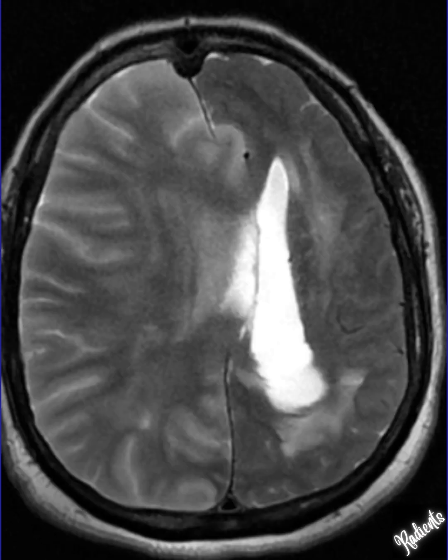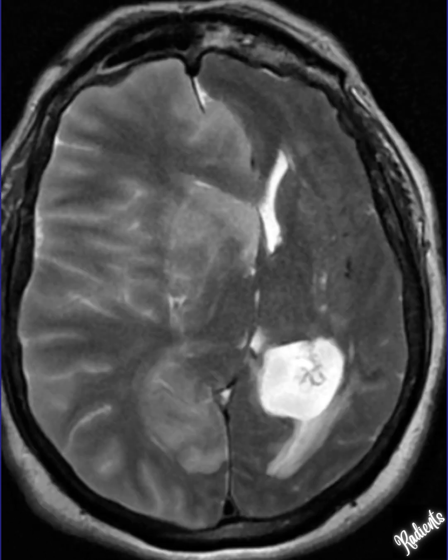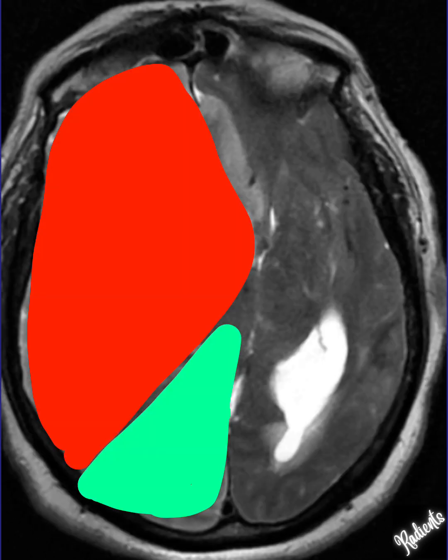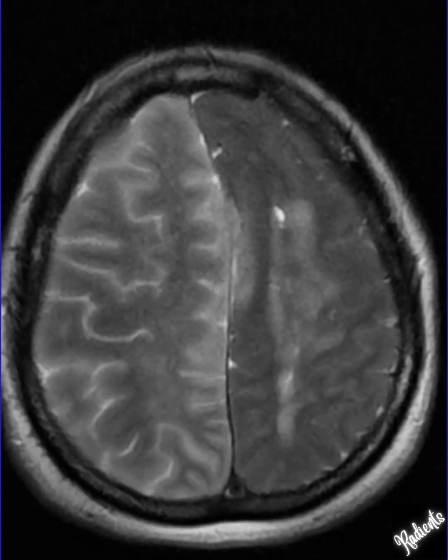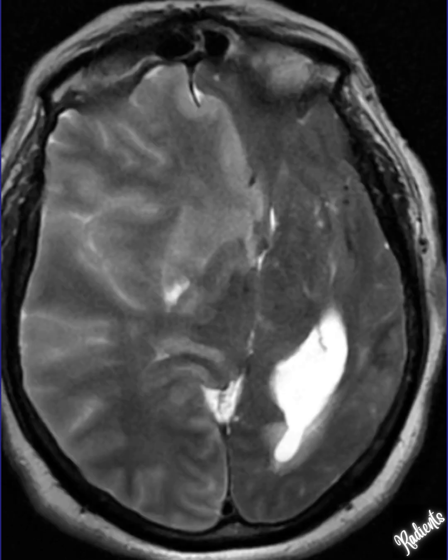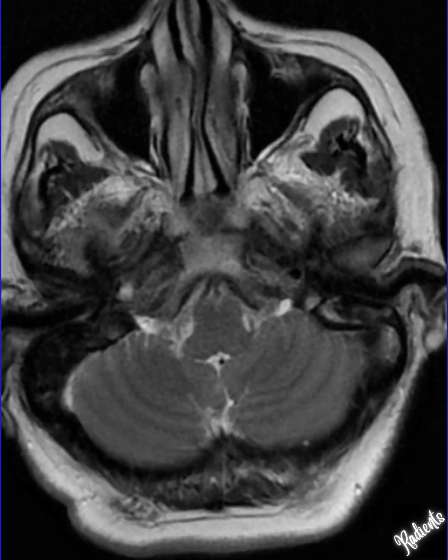Now if we look here as well, the PCA territory also shows hyperintensity and edema. So both the anterior and the posterior circulation have been involved. But more than that, what is more important here is, if we look here, look at the ICA on either side.